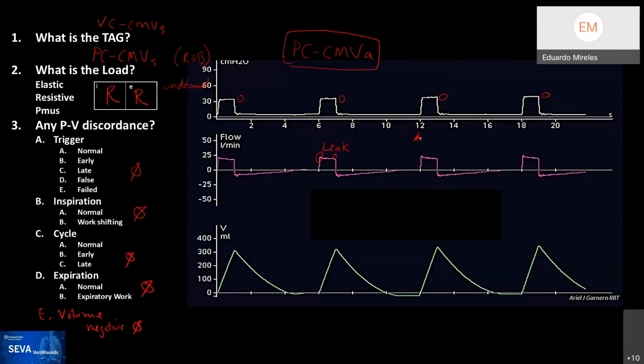You remember this triangle of the Hamilton that would tell you that the patient is triggering? So we don't see that. So I think that at the end of the maneuver number 2, there is a change in volume and there's a change in pressure. So this is what we would call an assisted breath. Right, Rob? Correct. Other comments?